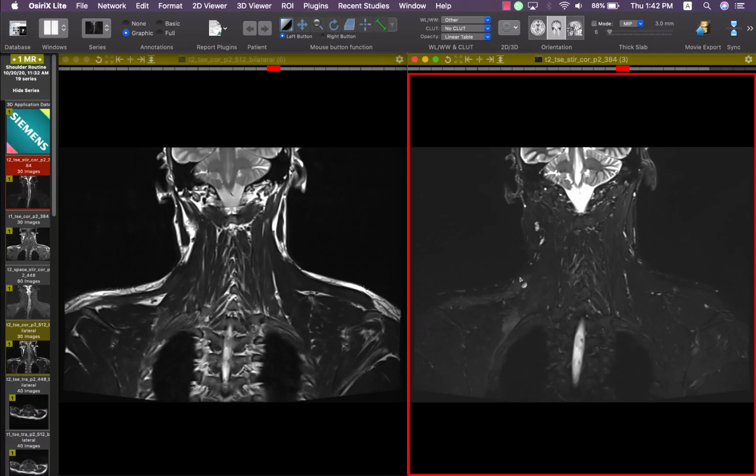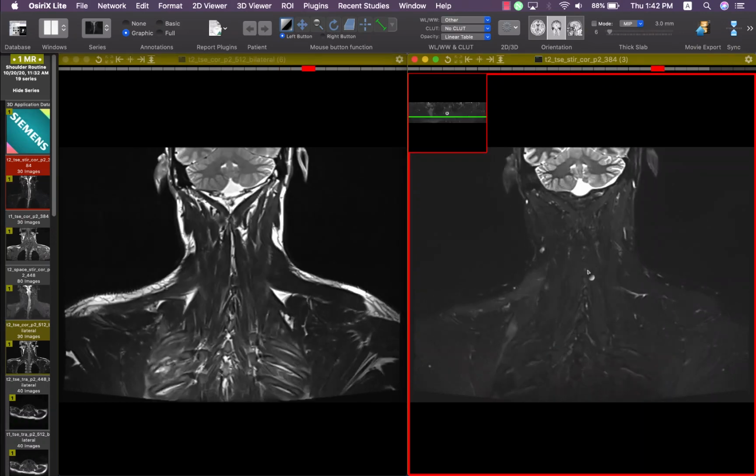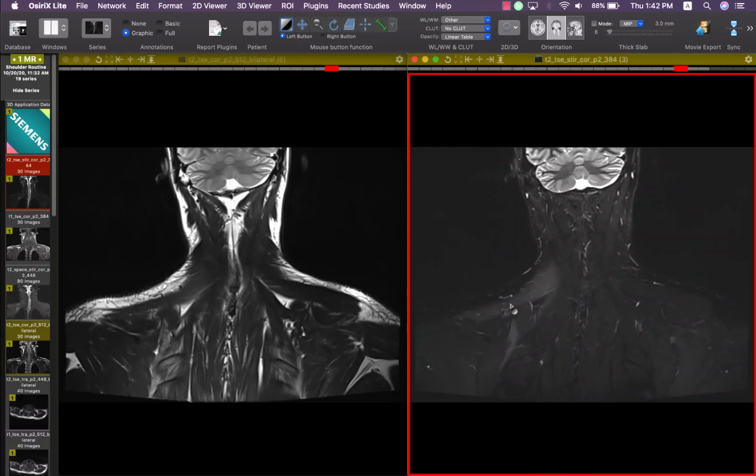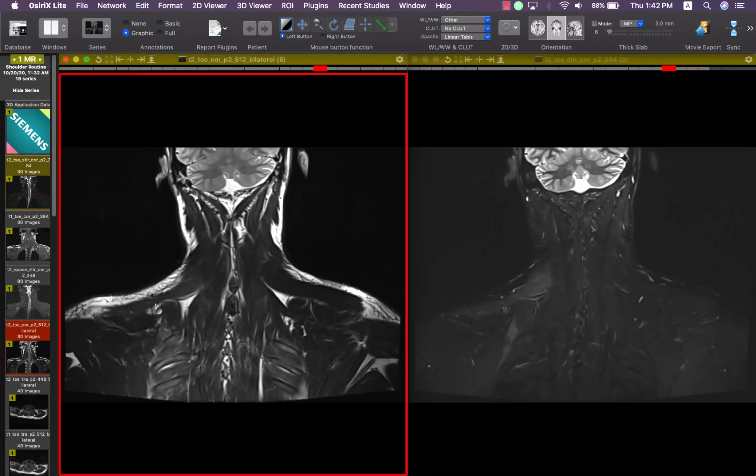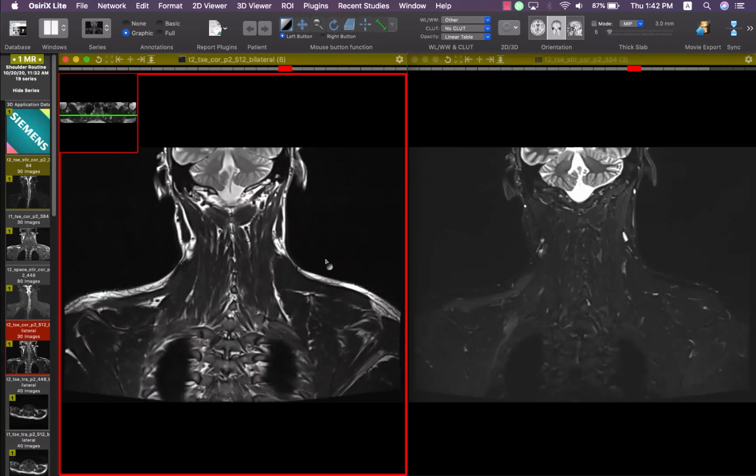Once you see a diffuse edema involving the whole length of the muscle fiber with no fiber disruption, you should put the possibility of denervation injury. So this is a pattern of denervation injury. Usually it is not acute actually, because if we compare the girth of the two trapezius muscles on both sides, we can see there is a reduction in the girth of the right trapezius muscle as compared to the left side. So there is some sort of subacute to chronic stage of the denervation injury.